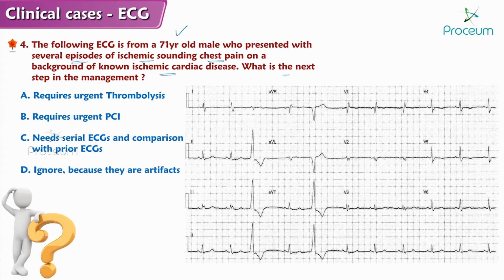Now what is the next step in the management of this patient? This is the ECG of this particular patient. You can observe what the abnormalities are. I'll zoom this ECG for you.